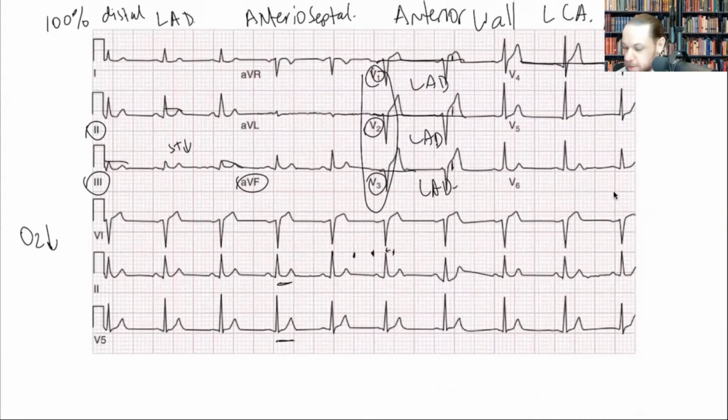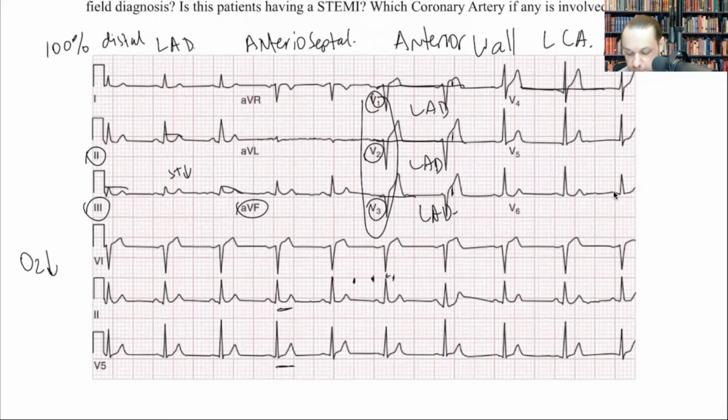Even though I don't see ST segment depression right now, like I said, this here is distal left anterior descending, right? And maybe as this is ongoing, these segments will elevate even higher, and then you'll start to see these segments depressed, right? I'm not saying it may not occur, but right now I don't see it.